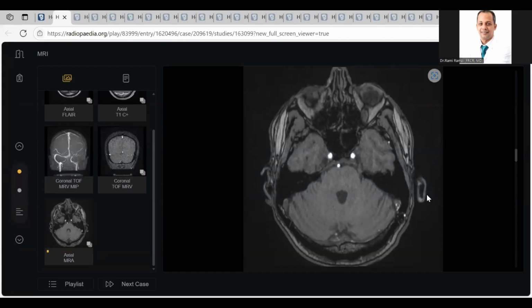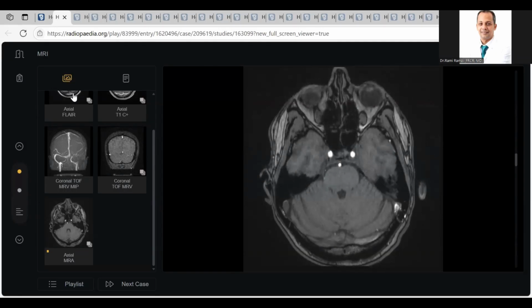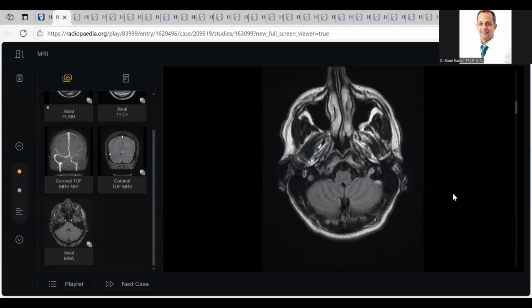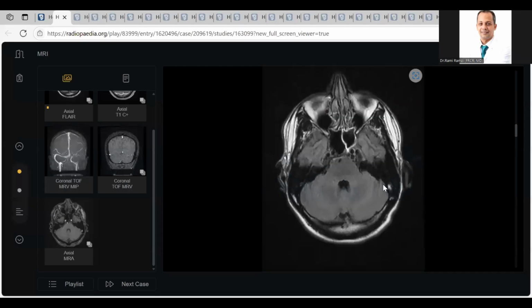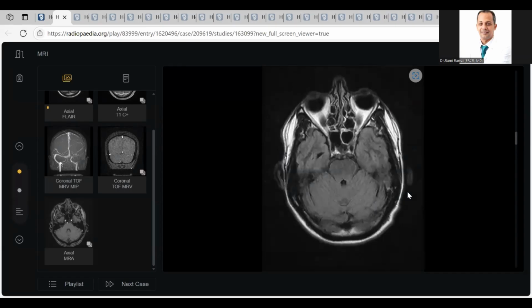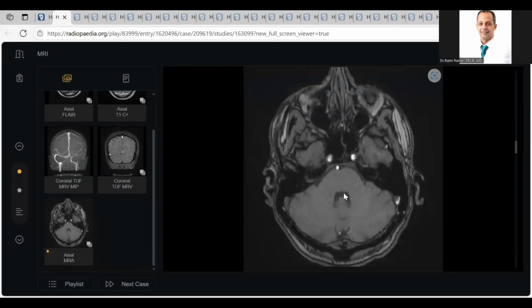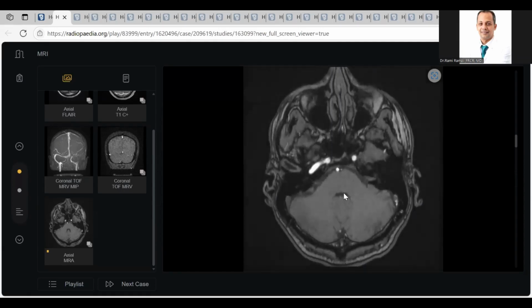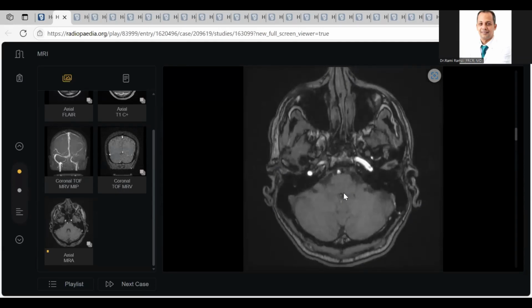See, my colleagues, this is one of the scenarios that most of us face inside the exam. You find something abnormal here in the beginning. Very good. Your start was amazing. Very subtle, but you picked it up. It is better to say there is a signal abnormality rather than a mass lesion. Why? Because it opens the window of the differential diagnosis. After I showed you this, this is not a mass lesion. There is some abnormality in the vessels of the brain, whether veins or arteries.